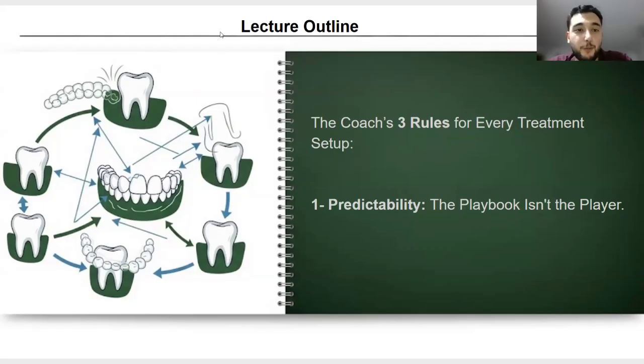What we see, this is something we've previously mentioned, what we see on the treatment simulation is not what's going to translate clinically until you understand that what you see in the simulation is a representation of the force system, not the movement itself. So when you see the teeth moving on the treatment simulation, it's not the teeth that are actually moving, it's the plastic of the aligner and how it's going to cover those teeth and how it is going to apply forces to those teeth until we reach the final needed position.